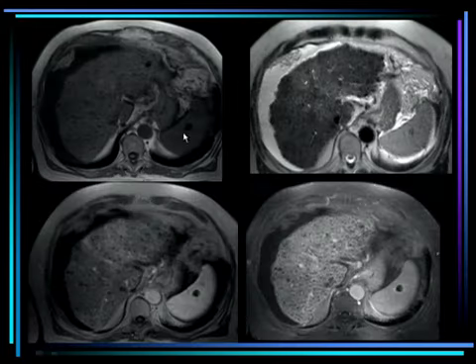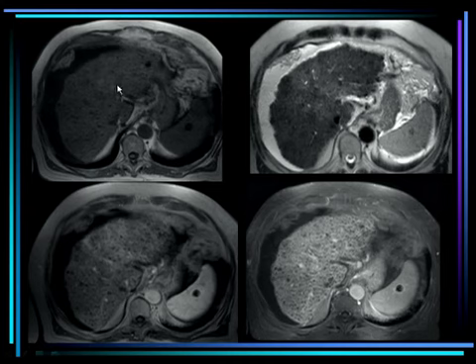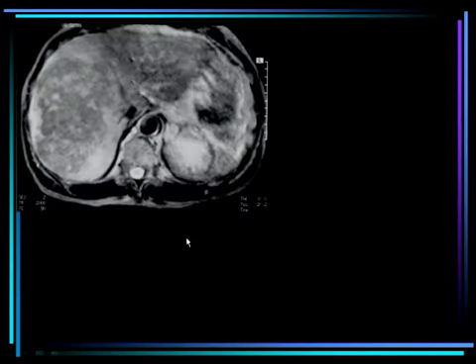So one of the reasons that you might have hemoperitoneum is hepatocellular carcinoma that bleeds. Sometimes it's very difficult to see hepatocellular carcinoma. You see that you have here in MRI T1, T2, inhomogeneous parenchyma. The surface of the liver is very inhomogeneous with this nodular appearance. But where is now the hepatocellular carcinoma? Those are multiple nodules, and you might suggest that this is the hepatocellular carcinoma, and it was.